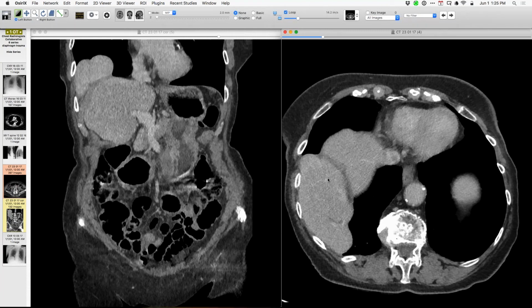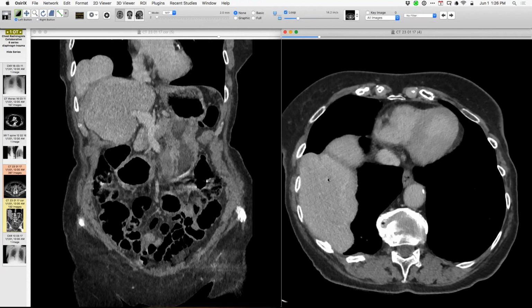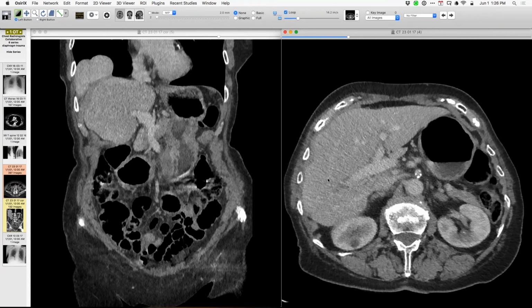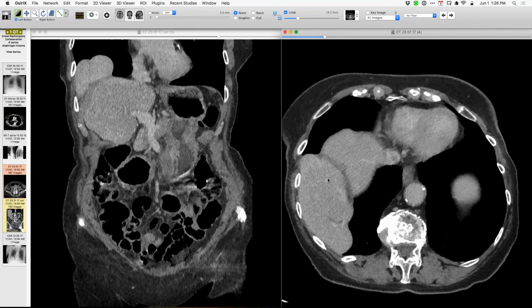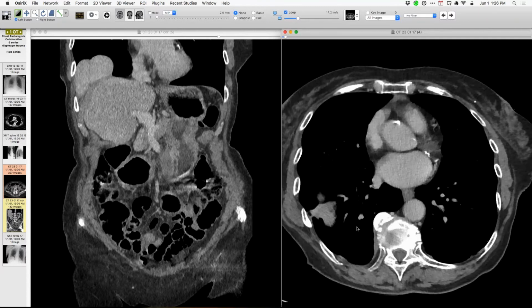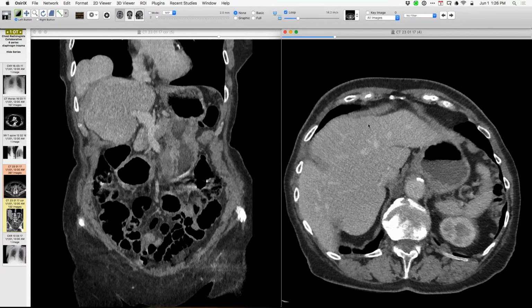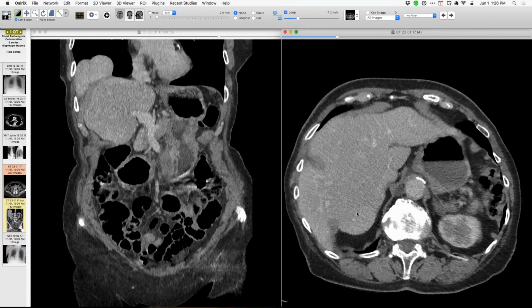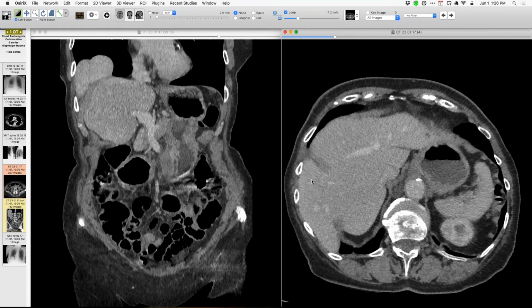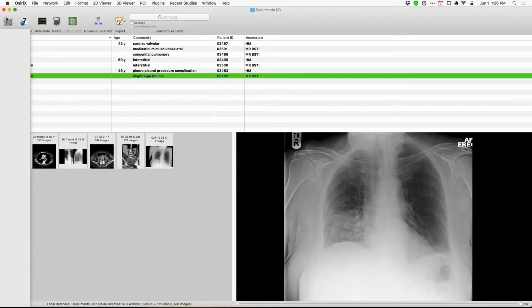So the initial injury, 2011, and then these more recent findings became apparent in 2016 and imaged again. You can see here posteriorly that portions of the diaphragm are intact, like here anteriorly and here posteriorly, but it's focally over here where the injury is, posterior and lateral. So a nice example of that.